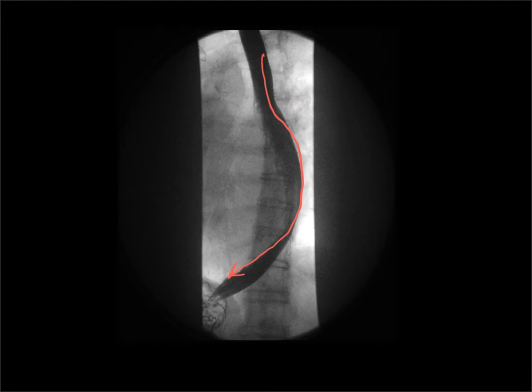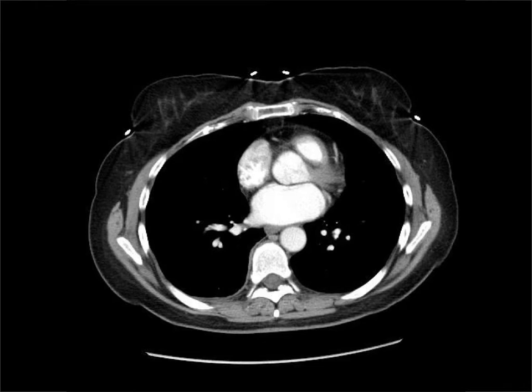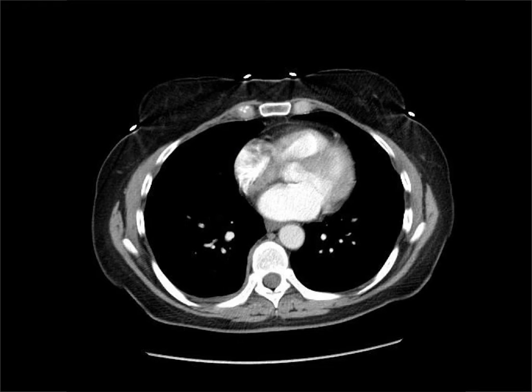So sometimes we diagnose left atrial enlargement on a barium swallow. I'm just going to run down the cardiac chambers on a series of axial CT scans before we look at the valves, just to make sure you know them all. So left atrium, right atrium, forming the right heart border, the ascending aorta, and this is the pulmonary outflow tract. We're just going down a little bit lower, a little bit more caudally.